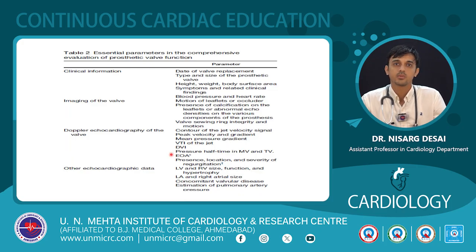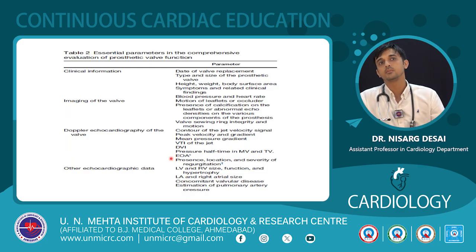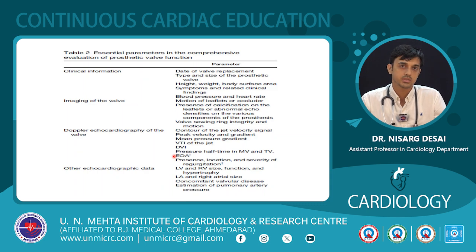Then pressure half time, especially in case of mitral valve and tricuspid valve, not so in aortic valve. Then EOA, the one that was previously discussed, and whether there is any regurgitation, whether it is a pathological one or just a washing jet. All this will be studied in the next slides.